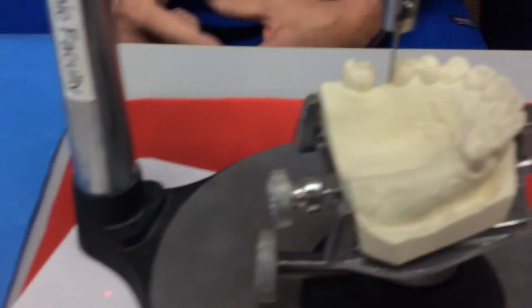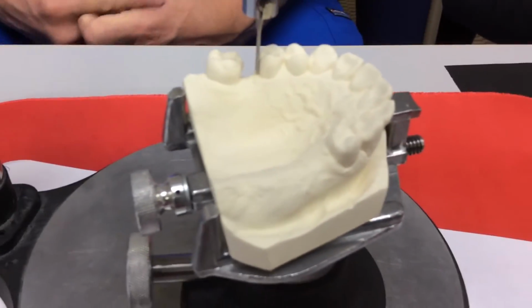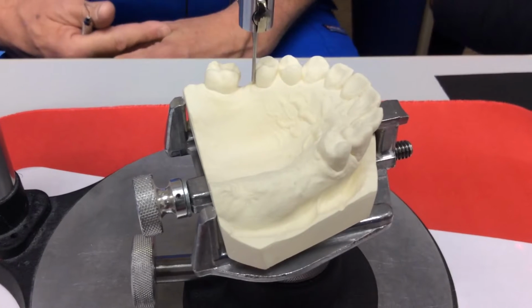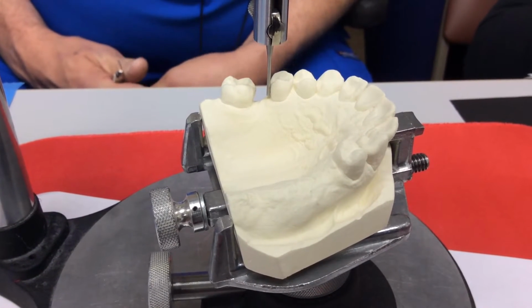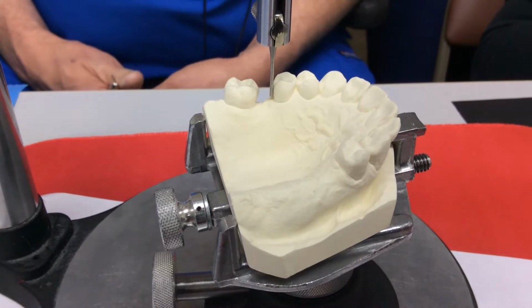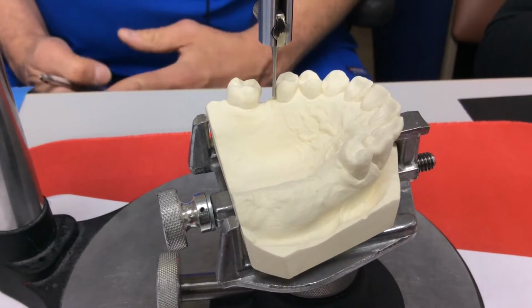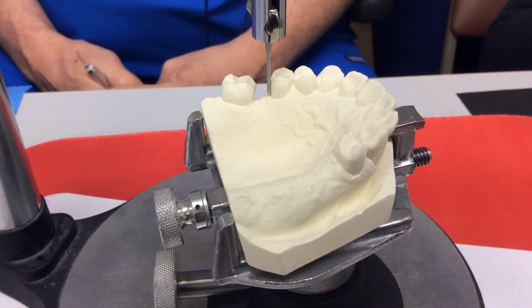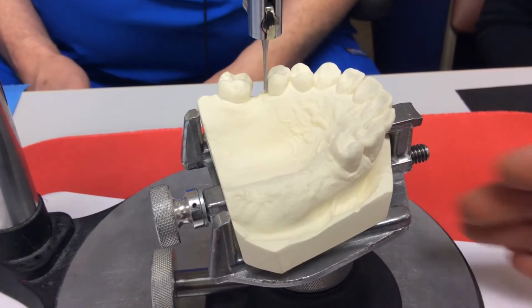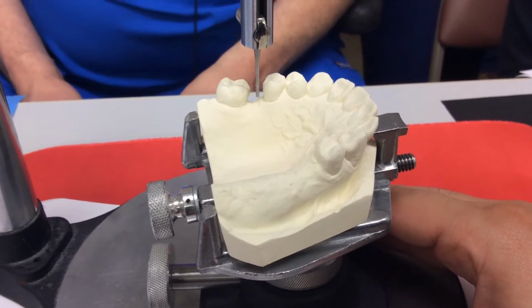When you draw me your little red square, your little red rectangle, it should go almost to the marginal ridge, and it should come down about 3 millimeters or so would be a nice average. Okay? Somewhere between 2 and 4 millimeters down the side of that too. Then from there on down to the gingiva, you want a little bit of space. If you don't have space, the lab's going to block out and make space anyway. You want a little movement of that framework there.